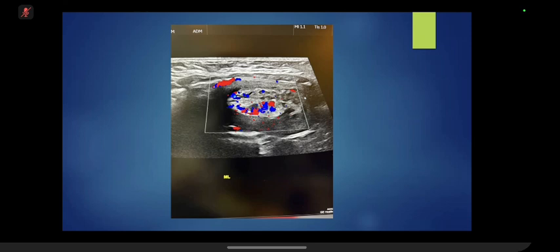However, I'm concerned because I could localize some free fluid in the left upper quadrant, and this could be suggestive of impending perforation or impending ischemia. I'll be red flagging this case, and I'll be urgently contacting the on-call pediatric surgery team. This will require a hydrostatic reduction.